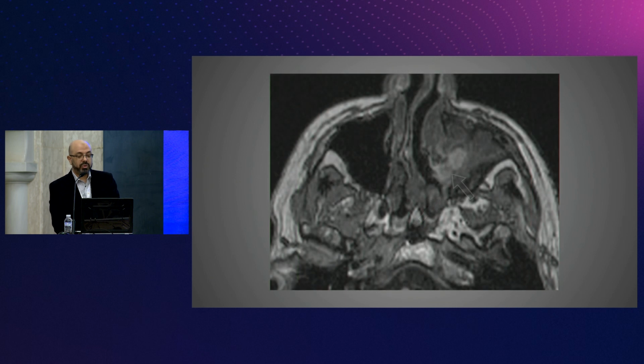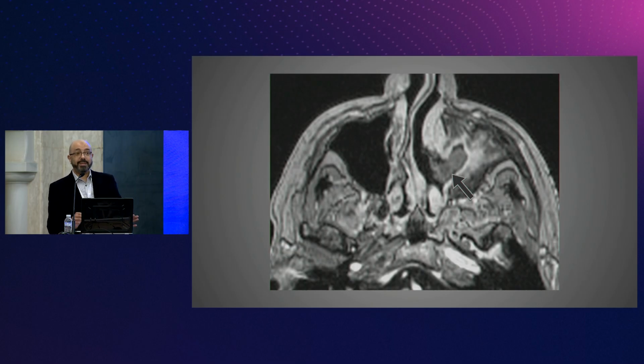That's the T1 without contrast. See, never rely on a T2 in sinuses. If you skip the T1, you'll be missing a lot. And that's the post-contrast. It's not enhancing, so this is fungus, but the patient is presenting with what? Left epistaxis, so we need to be a bit cautious.